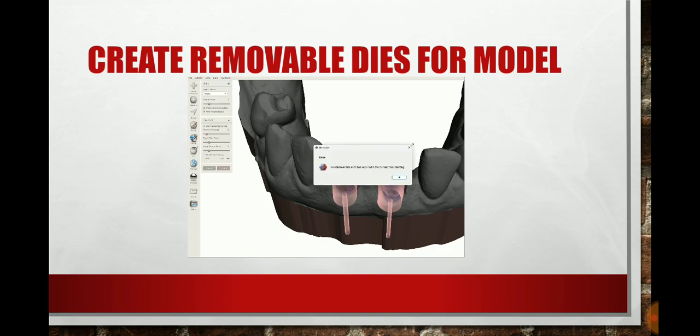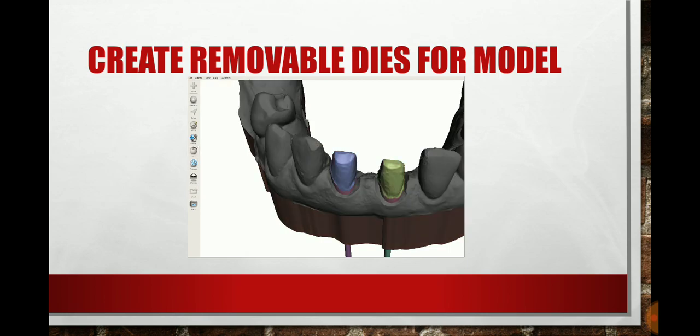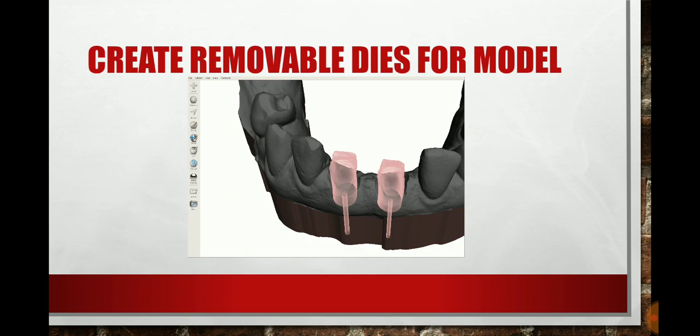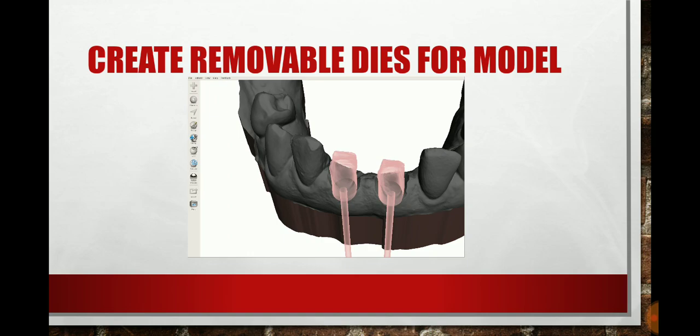So that is pretty much all I've got. Try it and see if this is something that you guys would like to continue to do. Now, it takes a little bit longer than most, and you'll see me go back and forth and do some extra things in this one because I wanted to try something different. But that is pretty much all there is.